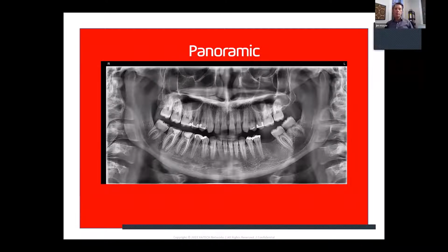I have a panoramic right here. Let's go through some common structures that we're seeing on the pan. And as we progress through, if you want to go ahead and talk track what we're seeing, we can go back and forth here. But first we've identified our TM joint on the device. Yes, we can appreciate the condyles, the mandibular fossa, and the articular eminence in that circle right there. The nasal septum right there, and the hard palate, and projected bilaterally is the hyoid bone.